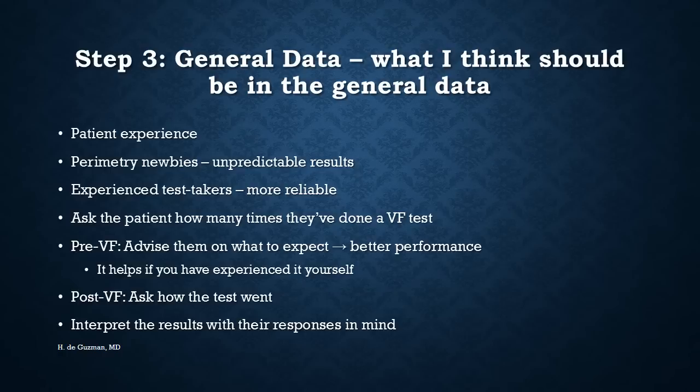I wish there was a spot there which indicates how many perimetry tests the patient has done already, because people who are new to perimetry can have very unpredictable results. So what you do is just ask the patient how many times they've done a visual field.